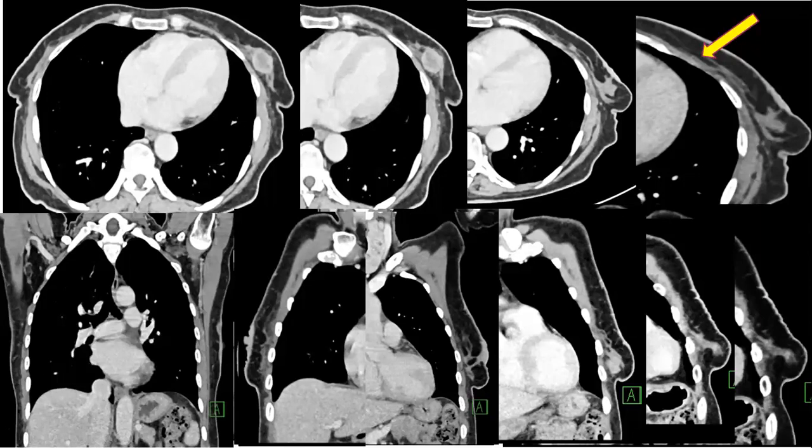But we have to be cautious, especially if the lesion is close to the nipple, search for nipple involvement. If close to the pectoralis, search for pectoralis involvement. If close to the chest wall, yeah, this is at the apex of the pectoralis, the lesion.